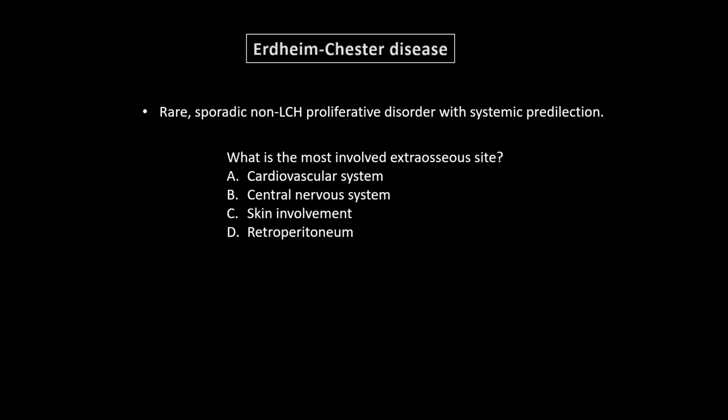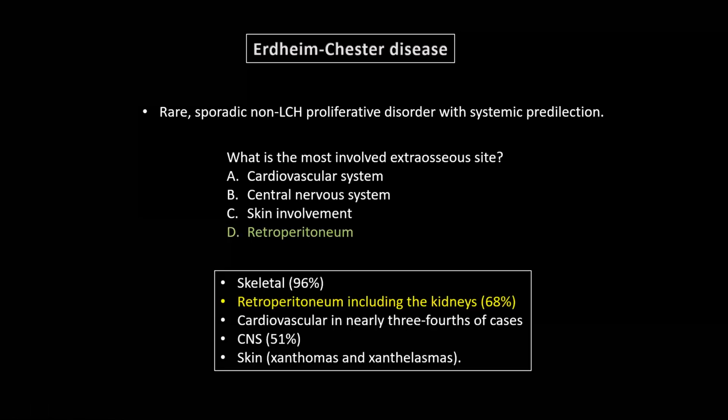Okay, ending it now. Sharing the results with you. So most of you said it's skin involvement. Others said it's retroperitoneal involvement. Okay, so the correct answer is the retroperitoneal involvement, including the kidneys. It's the most common extraskeletal site of involvement.